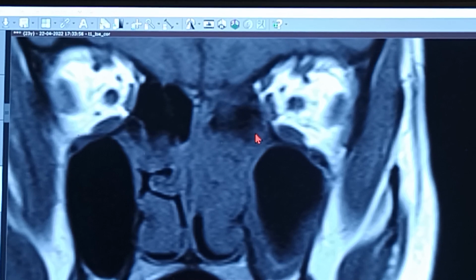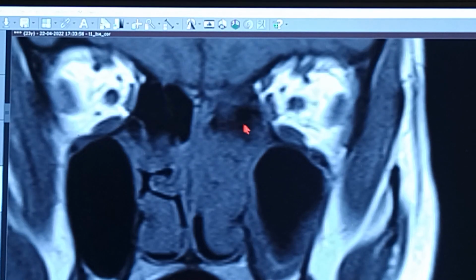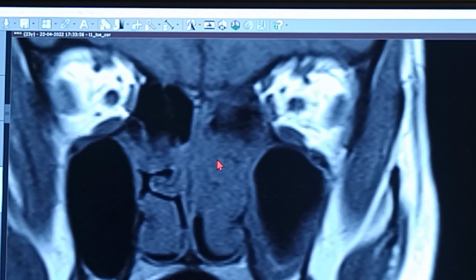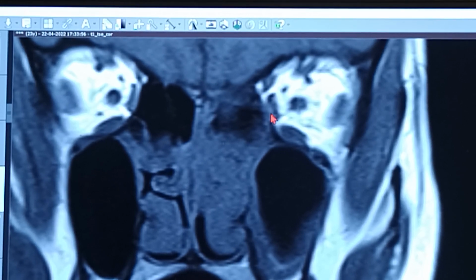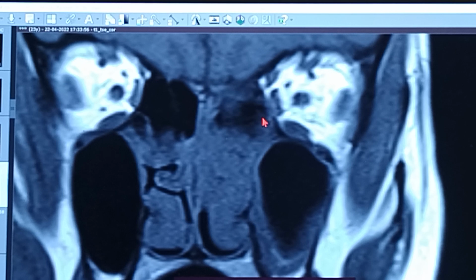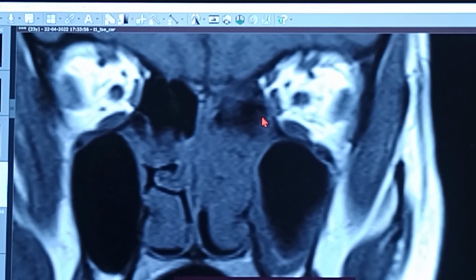This is basically soft tissue shadow. So this is T1, so the inflammation should be dark. So this is the same consistency, same shadow as this one. So this is dark. So this could be inflammation as well. So to know whether a muscle is under inflammation, we have to look at the T1 post-contrast scan, because on T2 as well, the muscle is not going to appear as bright white. So the T1 post-contrast scan is the best scan to study the inflammation of the muscles.